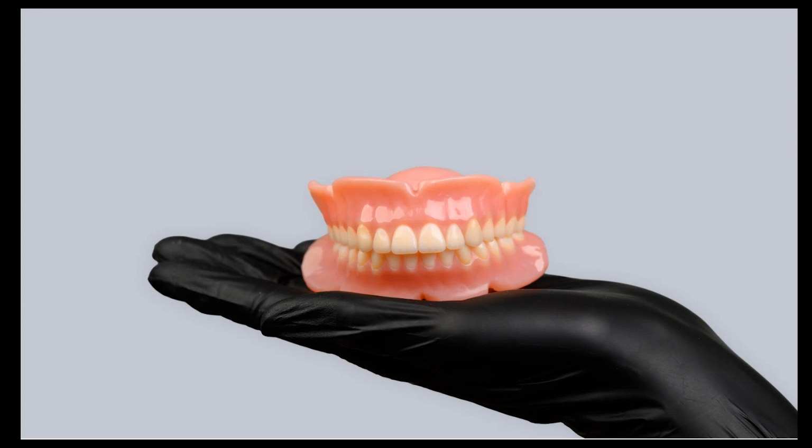Now, this is the new part with TrueVoxel. Analysis is triggered through the dental view button that is up on the top bar here. You see a new tooth icon appearing on the top. After you assign all of the base shades, you can select the tooth icon and open the dental view.